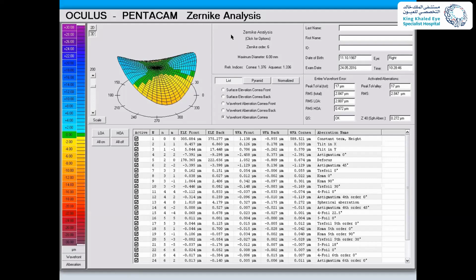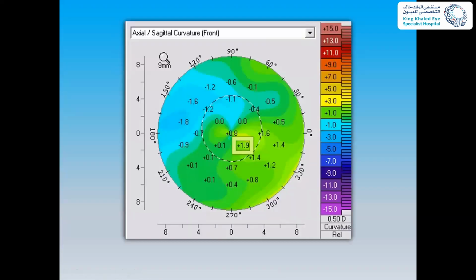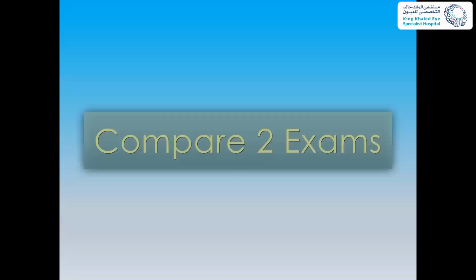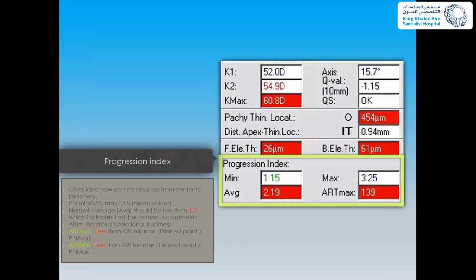How can we assess progression of keratoconus in the 4 refractive map? Okay, so again, progression of the keratoconus, let's go to the 4... how do I go back? Dr. Mohammed, in the meantime, we are trying to flip this.